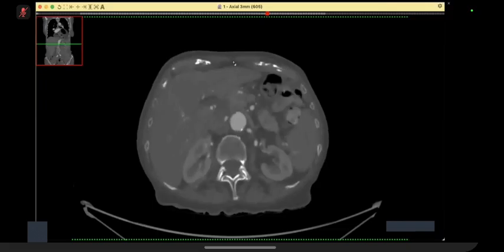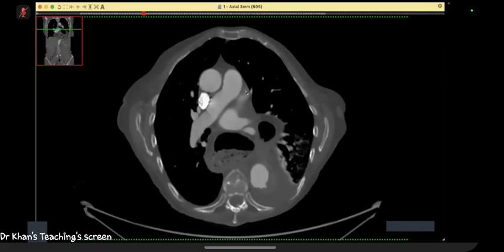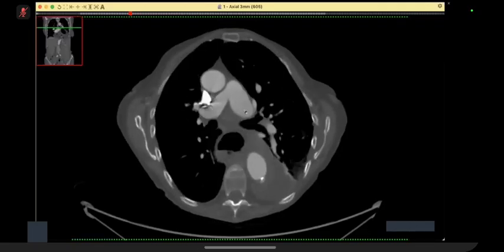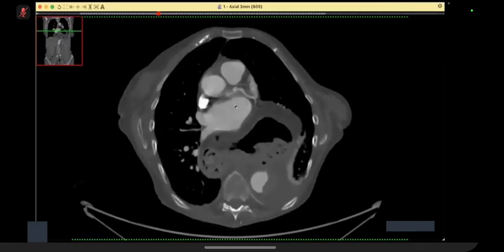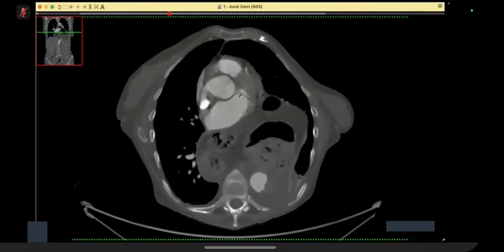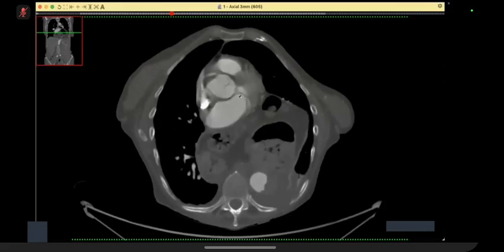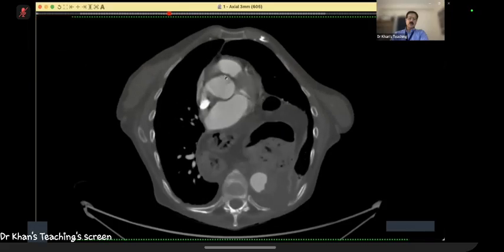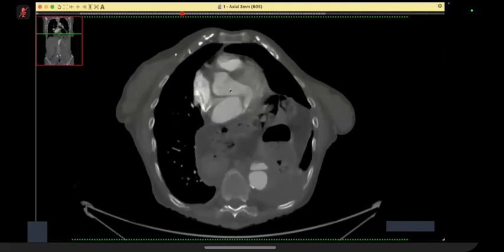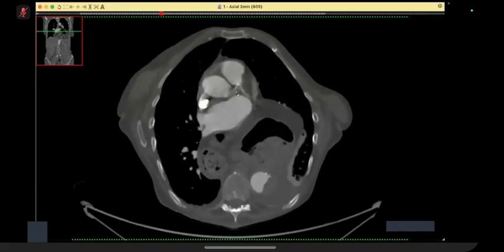I've given you a better window for aorta. So I'll go up to the heart. I've been provided with the contrast CT images in the arterial phase. Candidate 2, I want you to follow this, which is the ascending aorta, and please keep talking. Over to you.